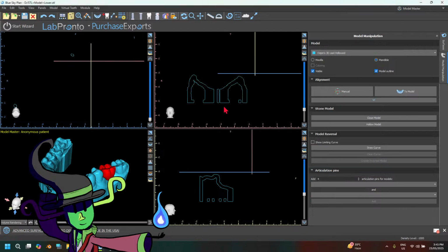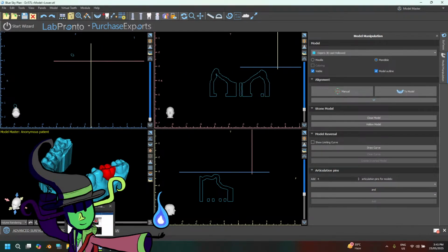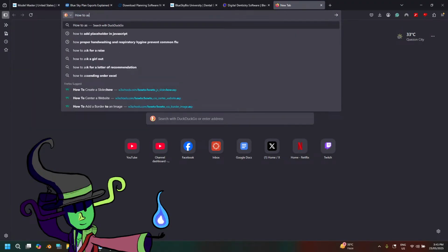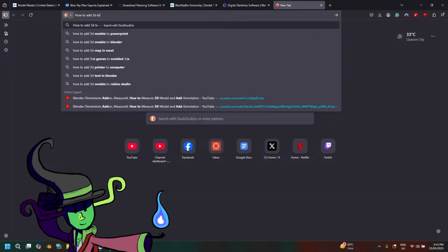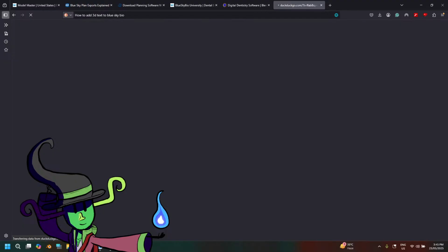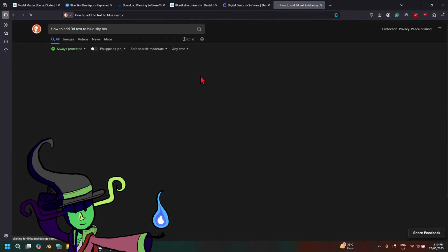Okay, I want to try to search this up myself. How do I add text? How to add 3D text to Blue Sky Bio, because that's a feature that's available in Blender for Dental.